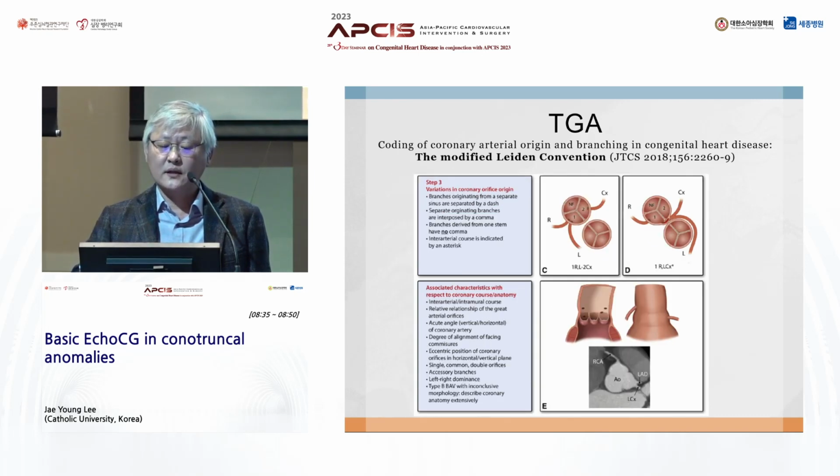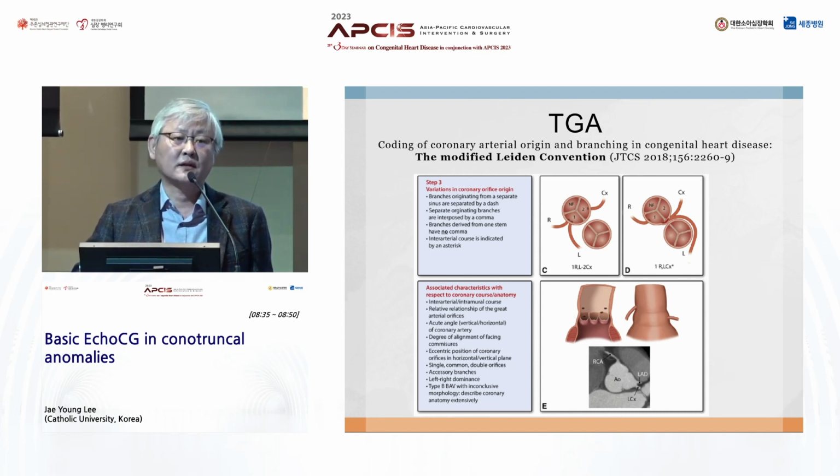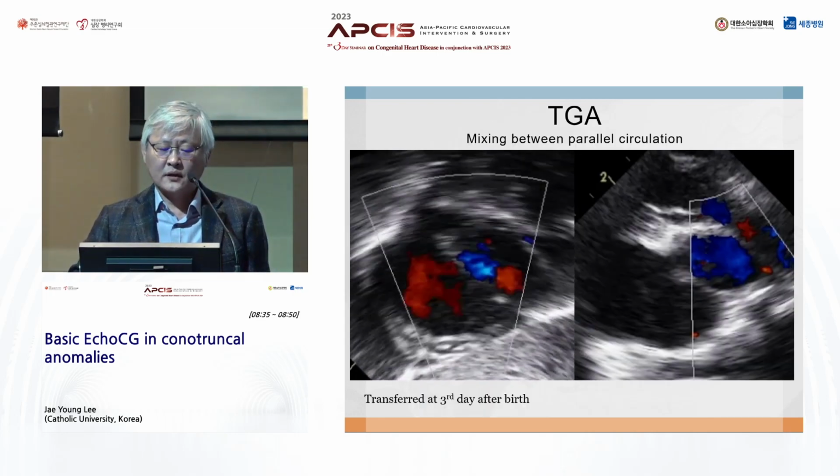And in this case, the same sinus, 1, R and L, but different orifice, described with a comma, and different sinus, dash, and 2, CX, and other associated conditions for coronary arteries.